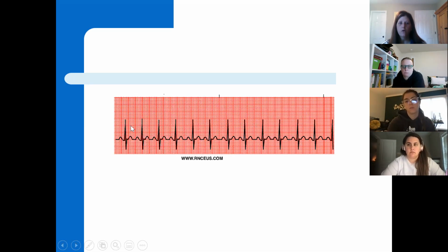So let's count it out. 1, 2, 3, 4, 5, 6, 7, 8, 9, 10, 11, 12, because I'm going to stop here. So what's my rate? 120. 120, exactly. Again, beautiful, round, upright P waves, QRS, and a nice, beautiful, upright and rounded T.